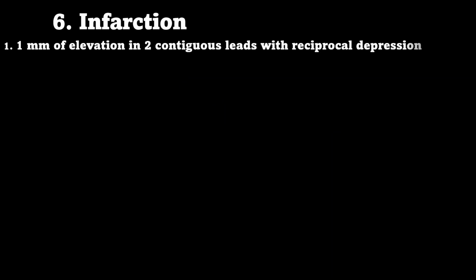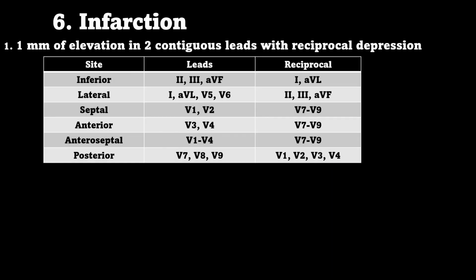Now we get to talk about infarctions, or a STEMI, which is ST elevation myocardial infarction. So for this, you need elevation in 2 contiguous leads, that is at least 1 millimeter, with a reciprocal depression. In this chart, you can see the various STEMIs and the leads to look at.